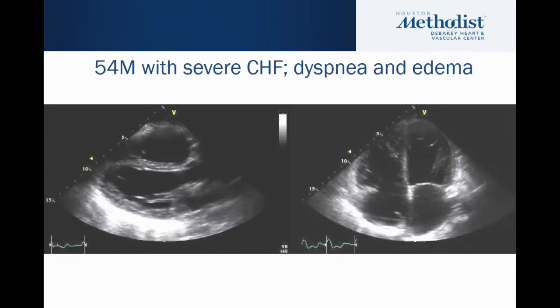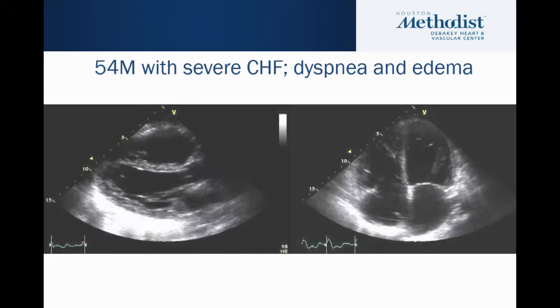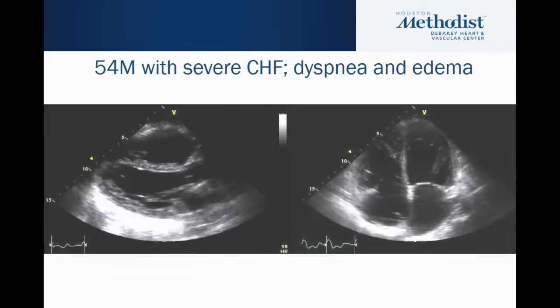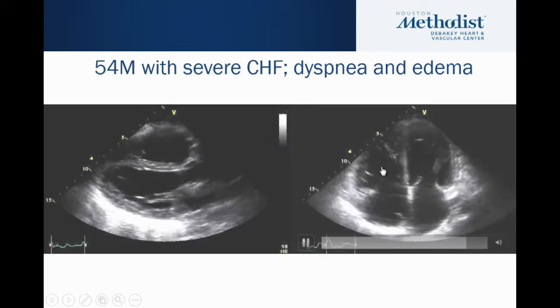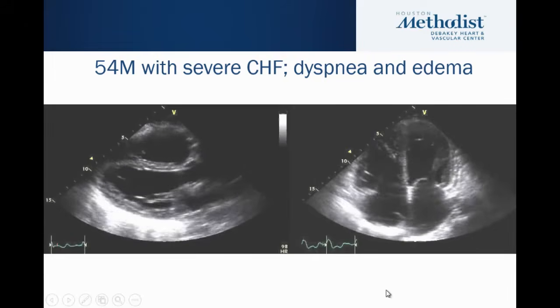Thank you, sir. Okay, do we need a Doppler here to know how severe the TR is? No, look at that. They're waving at each other, bye-bye. No need for any Doppler. Which is worse, the RV or the LV? Flip a coin. Yeah, very bad, right? This could be many things.